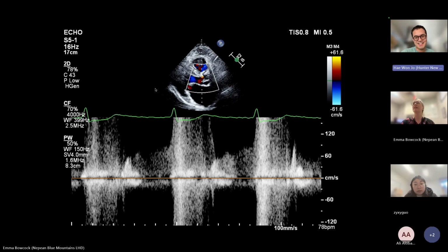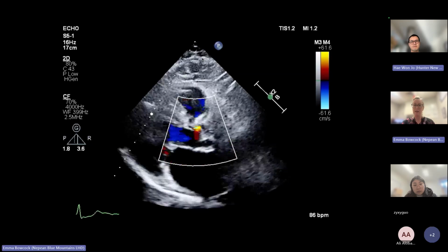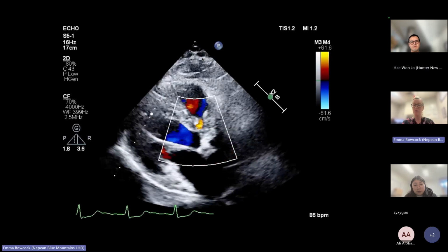I like to say it's a VSD. Yeah, nice. It's a mean one. But yeah, the sonographers just put it across the VSD. So you've got obviously a lot of flow above the baseline, which you would not expect to see in that view. And then probably mirror artifact below the baseline there, because it's a VSD with obviously left to right. And this is the 2D with color. Can you all see that?